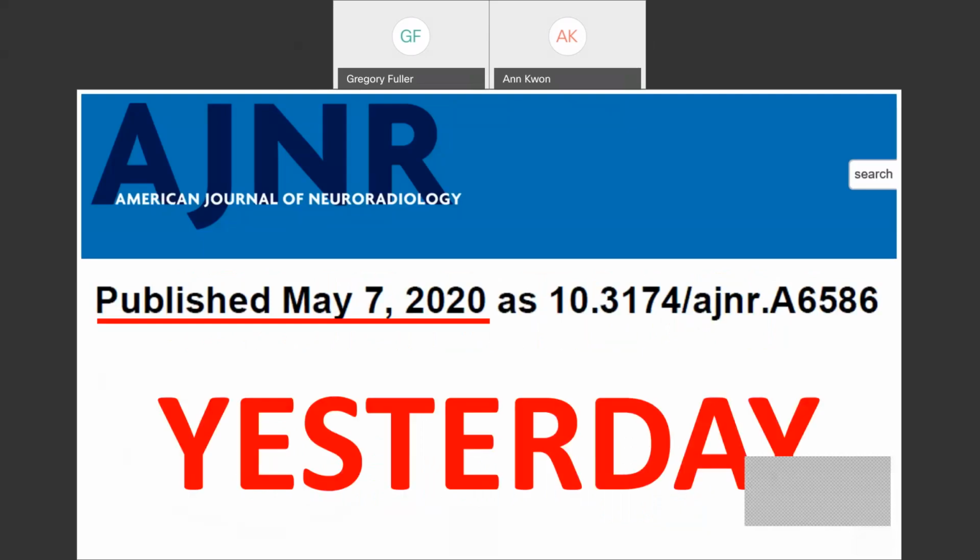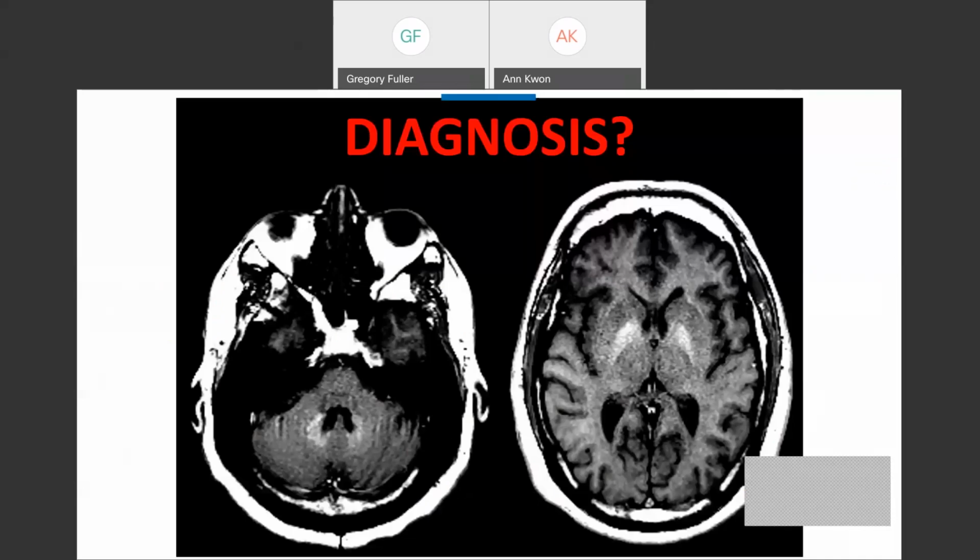Yeah, yesterday, that's right, no mercy. What's your diagnosis? I'm gonna wait. This is an MD Anderson case. It's not from the article. It's from the MD Anderson archives. Sanjay Singh, GAD, GAD, Michael Evans, a gadolinium deposition. Our neuroradiologists are nailing it. All right, gadolinium. Dr. Harb, that was a noble guess.